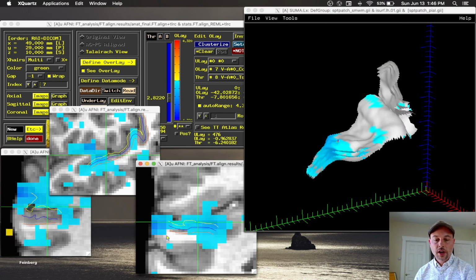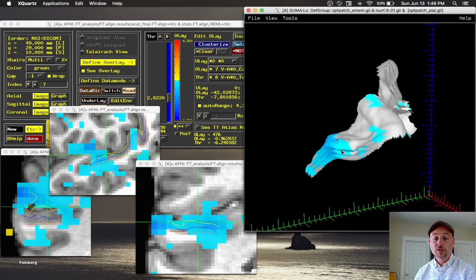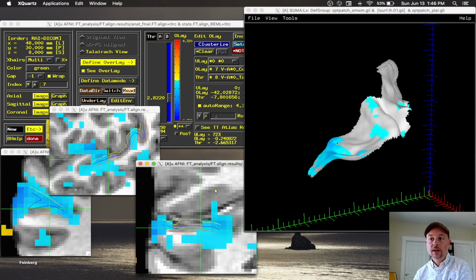Same data and contrast, but now I've extracted the auditory cortex from a FreeSurfer atlas and run surf layers on that surface patch. Where I click in SUMA is linked in AFNI. If I hide a patch layer and click again, I move into the middle of the cortex.